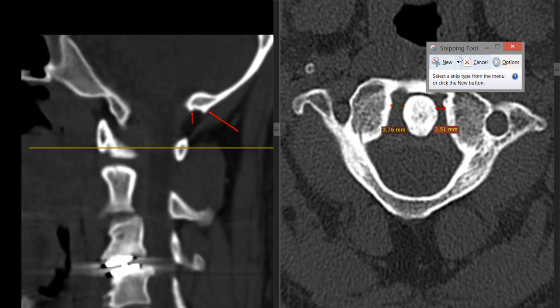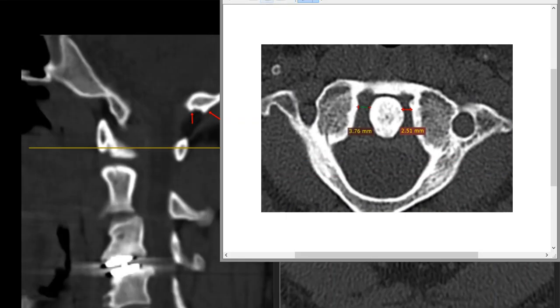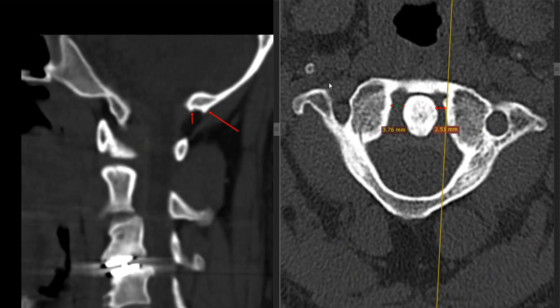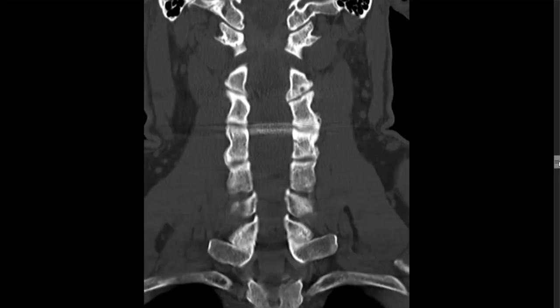It's more over time, when you have one deviation to another deviation to another, and then you have these little one-off problems that cause multiple symptoms. So let me pause, and we'll finalize this with just looking at the skull.